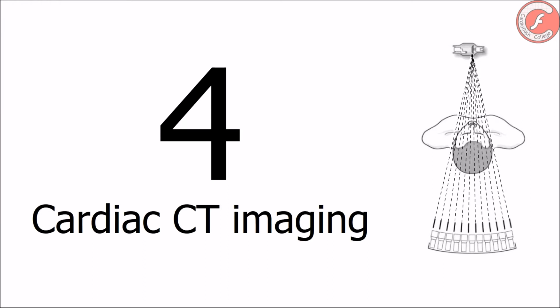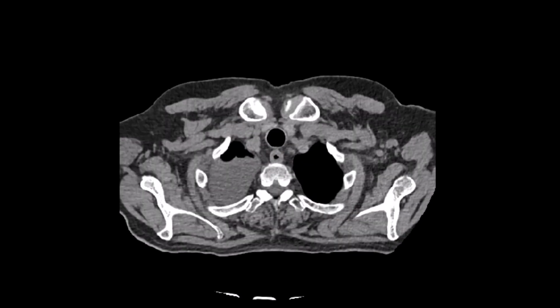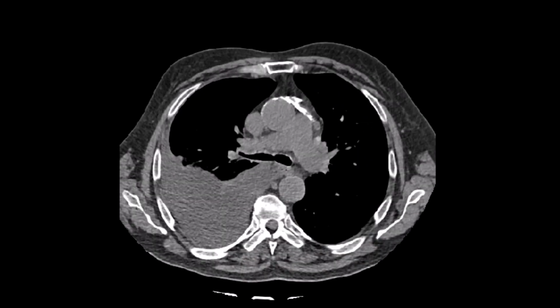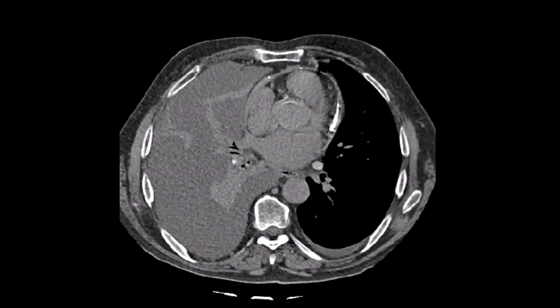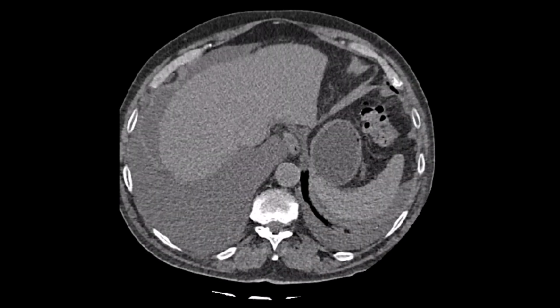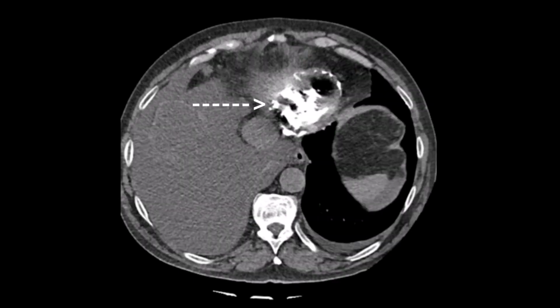Number 4. Cardiac CT scan is a useful tool in the study of constrictive pericarditis because it constitutes a very sensitive diagnostic tool in cases of pericardial calcification. As you can see, in this case, calcium is especially abundant in the inferior portions of the pericardium, which can suppose a difficult challenge in a hypothetical surgical scenario.